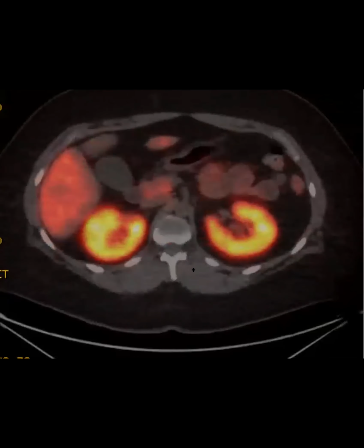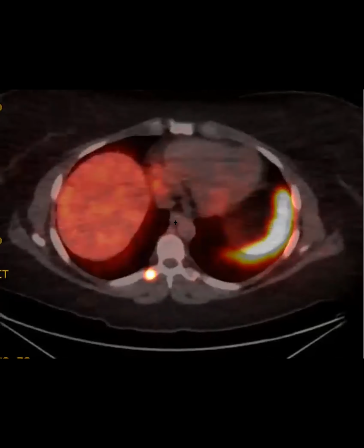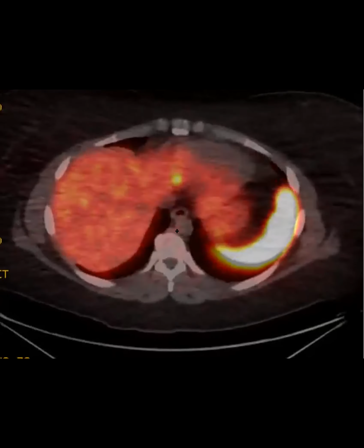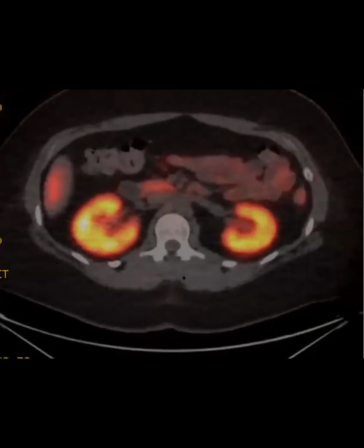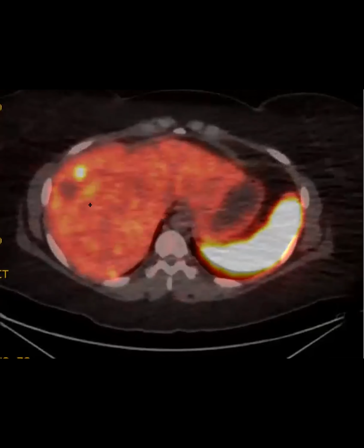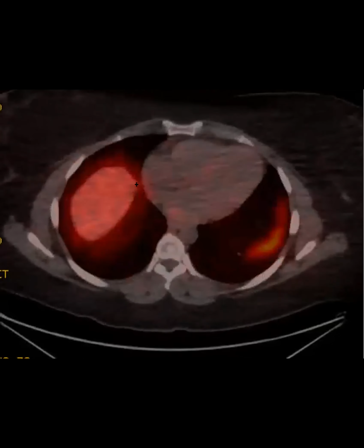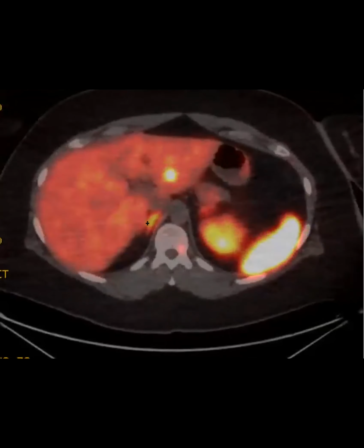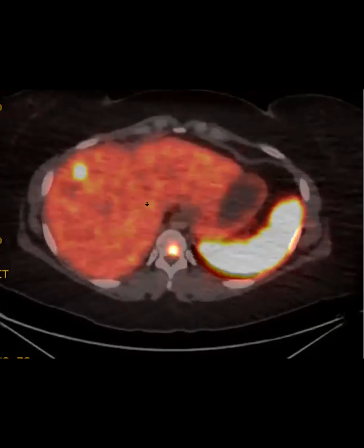It was just interesting to me that something could be so subtle on T2. I really only saw one lesion, and I don't even think that lesion in particular is one of them, because you can see that one doesn't light up. Basically, those lesions were hiding on the T2. I pretty much didn't see any of them. I'm really surprised they were hiding on the diffusion too.